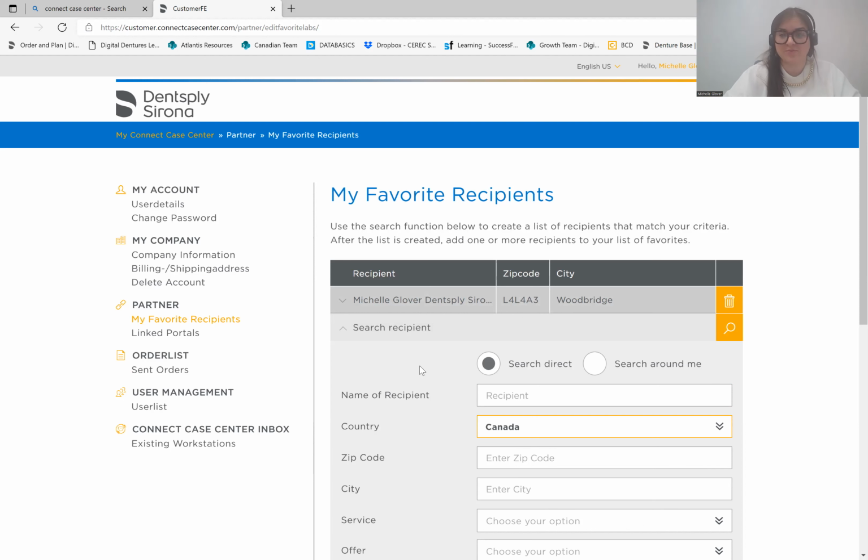So once you have your account completed, and again, I've already selected myself here as a laboratory, so I'm able to send myself details essentially, okay? So I'm just going to stop sharing the screen again, and I'm going to reshare the inLab software now.